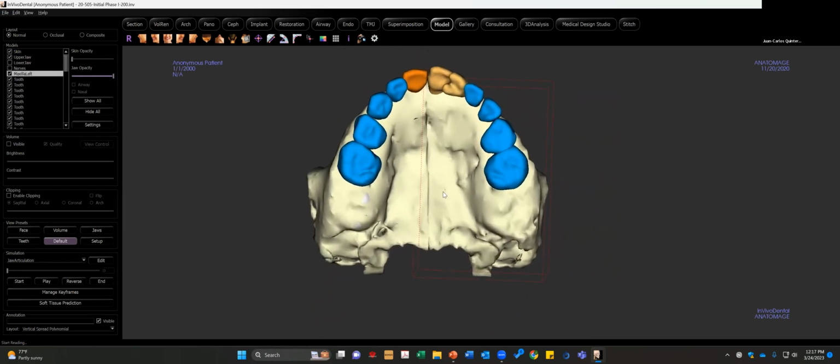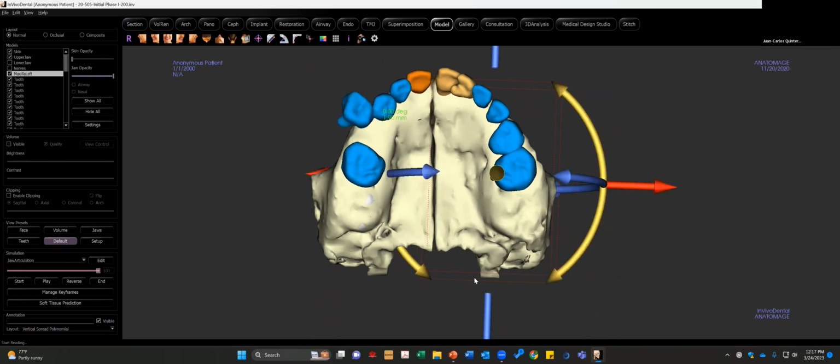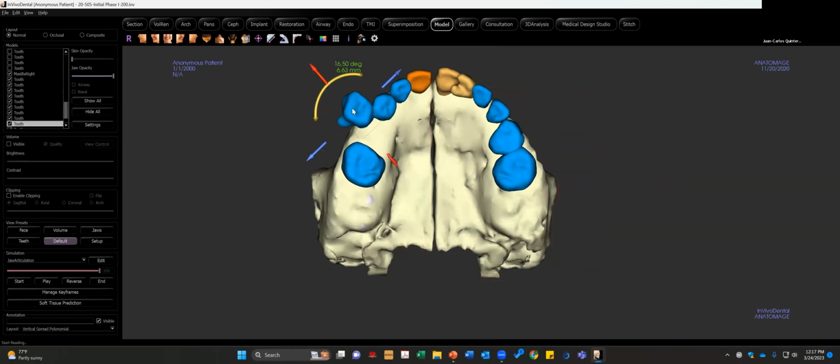So this is very important because in our office, depending on your philosophy, we do a lot of palatal expansion. Maybe I should put this baby molar back where it belongs, okay? In good periodontal housing. Okay.